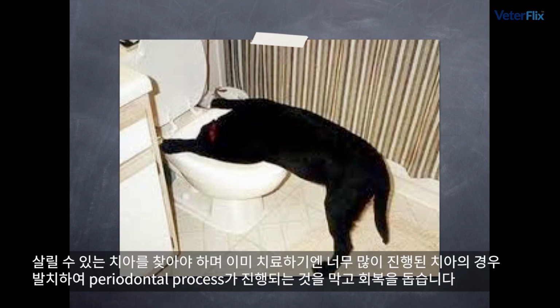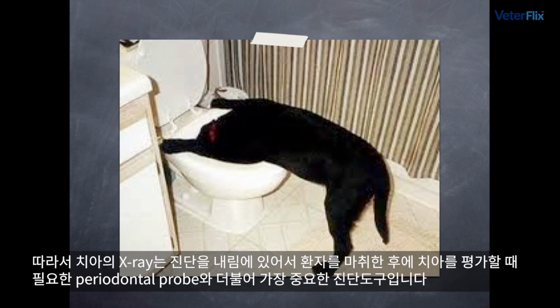We need to find those teeth that can be saved, or those teeth that are just too far gone for us to do anything, and we need to get them out of there and let that mouth heal and stop that periodontal process. So dental x-rays, absolutely, for making a diagnosis, are probably your number one diagnostic tool, along with your periodontal probe, as well as grossly assessing those teeth with the patient under anesthesia.